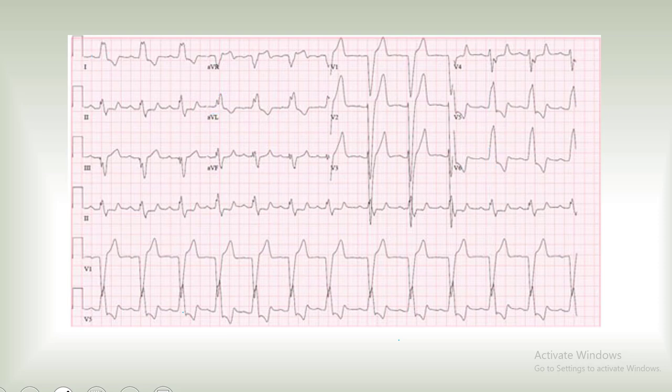You can also appreciate the ST-T segment abnormalities. In lead V6, we have ST segment depression and T-wave inversion, but the QRS complex is positive, so we have ST-T segment discordance, which is usually normal in the setting of a left bundle branch block. And in lead V1, we have a negative QRS complex, an ST elevation and a T-wave that is upright. So those are the ST-T changes that you can see in the setting of a left bundle branch block.